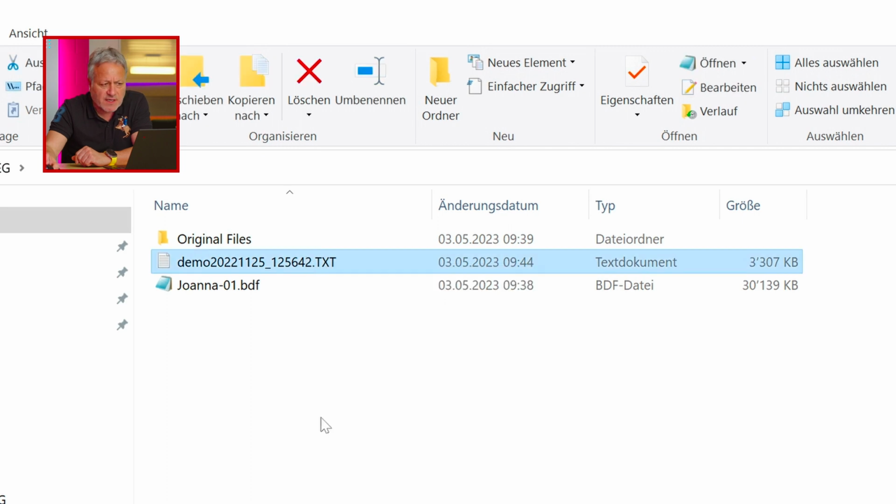We have a text file, which initially was an OMM file, but every NIRS system from Shimadzu allows you to export the OMM file as a text file. Currently in ActiView, we can only convert or read the text file, but that's okay because it's a simple process in the NIRS system to export it as a text file. However, in the future, there may be a release of ActiTools that actually also can read an OMM file.